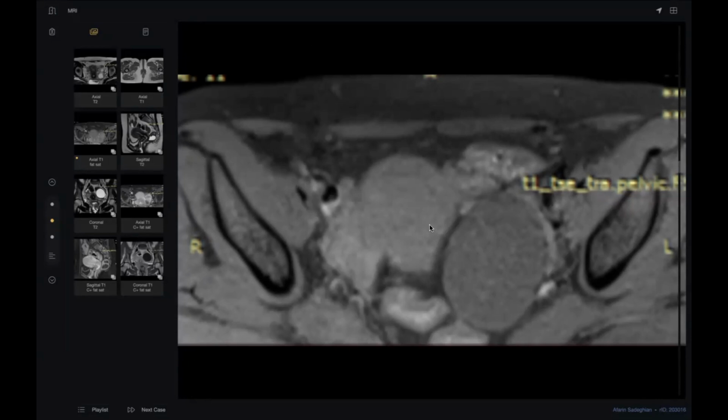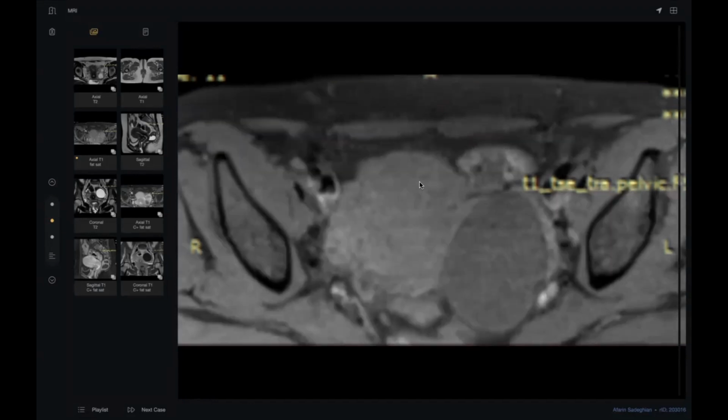When you are confused in a case like this, tell the examiner, this is a hypo-intense lesion in comparison to the uterus or to the smooth muscle. Usually, we take the skeletal muscle as a reference. Here in gynecology, you can take the uterus as a reference, and also it is a muscle. See, the skeletal muscle has nearly the same signal as the uterus. So this is hypo, okay?